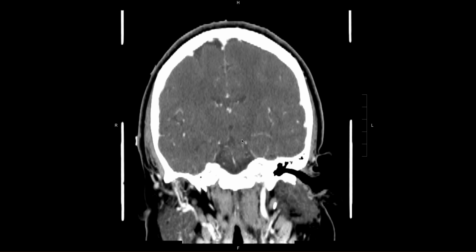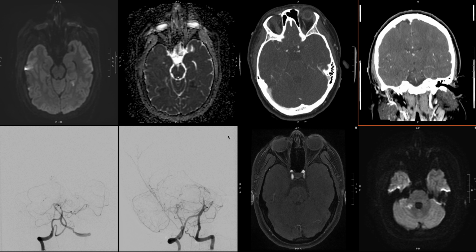and ultimately on call, when you see this either on the MRI or on the CT, which is the focus of this case series, you want to do a very similar thing where irregular basilar, areas that are not opacifying, this is basilar thrombus unless proved otherwise, and you want the patient to get a referral to someone who's an endovascular neurosurgeon or neuro-IR so that they can take a look.